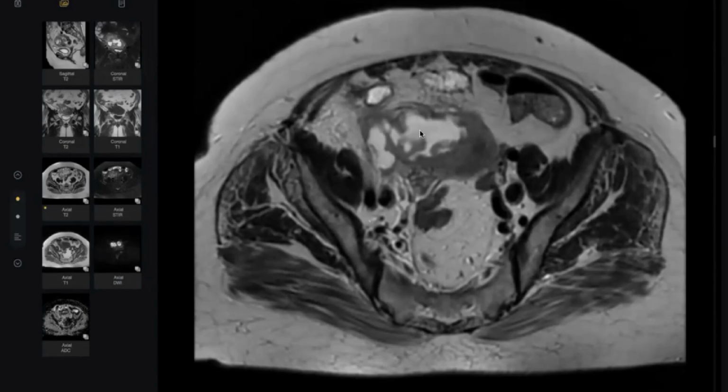After proteolytic enzymes are released from the white blood cells, there is destruction here, filled with proteinaceous material. So this is the cavity of the abscess. Phlegmon is complete granulation tissue. Abscess contains central breakdown, central cyst, central collection. Thank you so much, doctor. This is very important also in the spine.